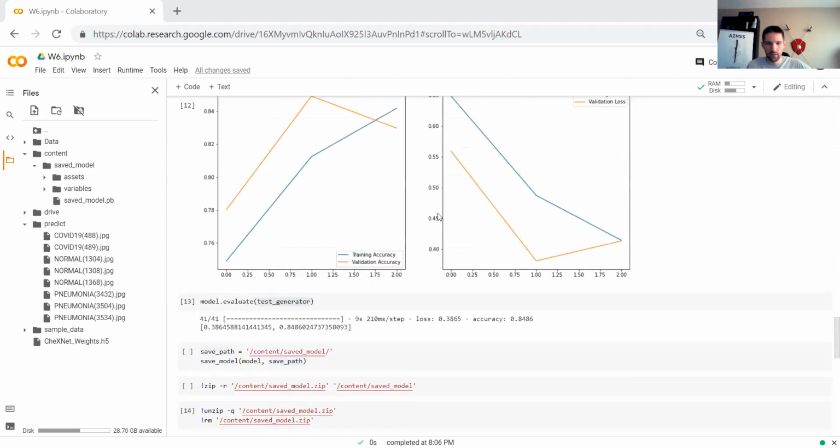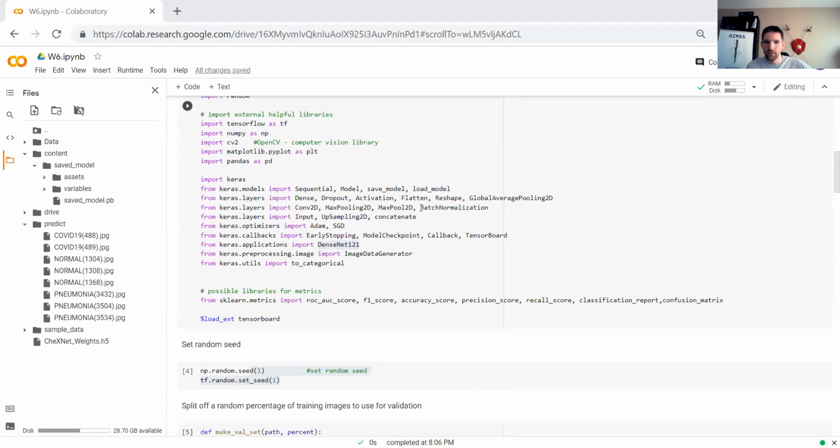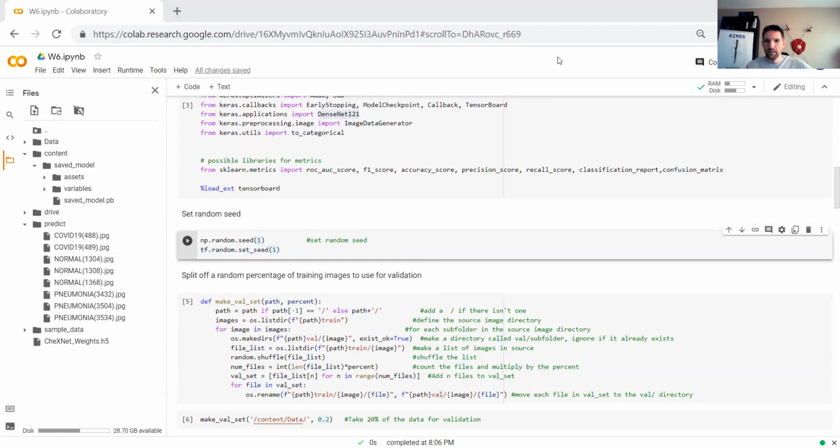There's a lot of code in here, and even if I did a good job making it sound simple, when you actually sit down and go through it, you'll find that every line has some nuances to it that you can spend a lot of time learning about.